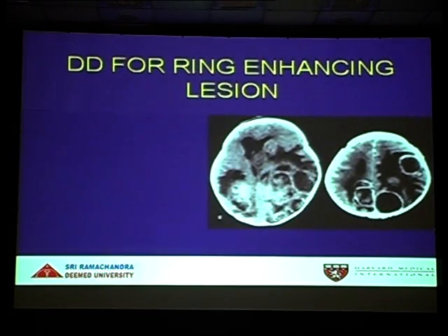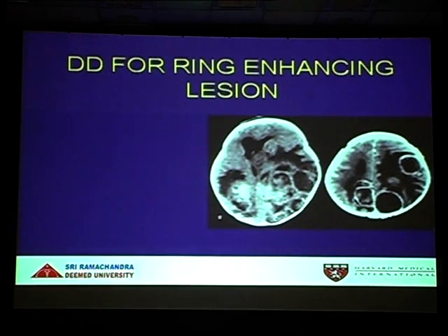This is also a very commonly asked one, the ring enhancing lesions in the brain, isn't it? So I've shown you the ring enhancing lesions in the brain, and this is all the surrounding edema. What are the common conditions? Yes, tuberculoma, granulomatous lesion. Yes, neurocysticercosis. Yes.